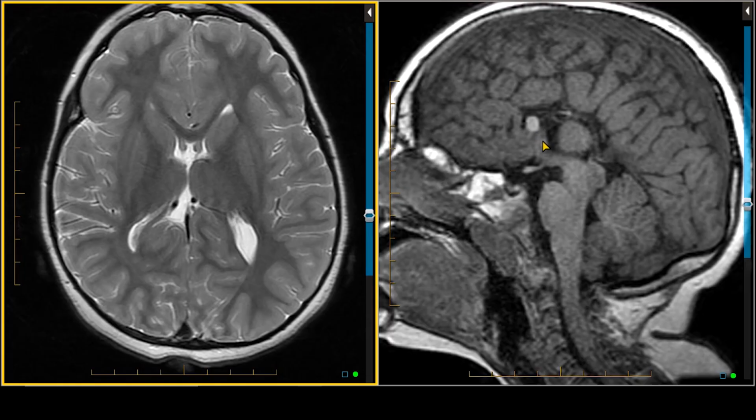In terms of other commissural fibers, we see a small anterior commissure right here. Otherwise, all the other features of agenesis of the corpus callosum seem present. We're seeing a low position of the distal branches of the anterior cerebral artery, which would have been the pericallosal artery. We're seeing absence of a cingulate gyrus. We're seeing these radiating gyri.